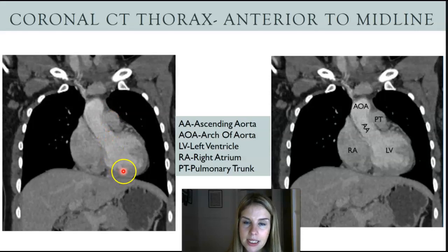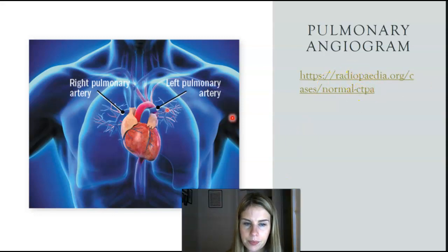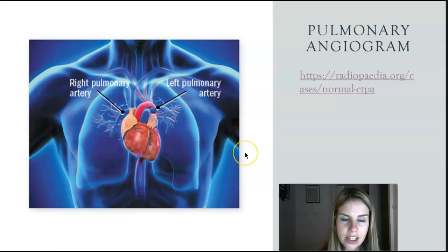Another thing that happens in CT is a pulmonary angiogram, to look at basically the blood flow going through the pulmonary arteries. So I want to just show you that for a wee second. Okay, so that's just loading up.